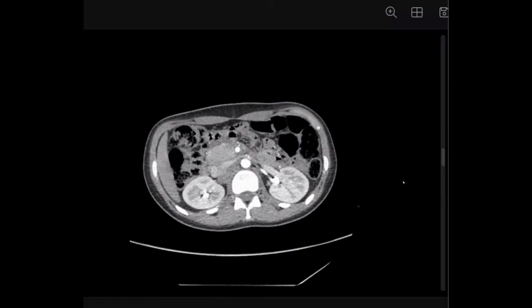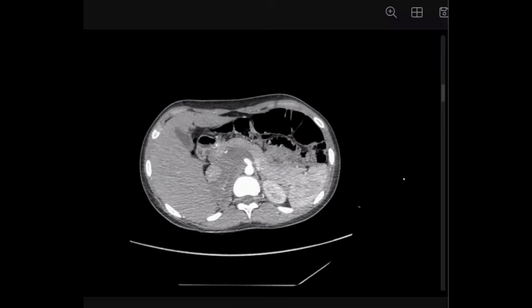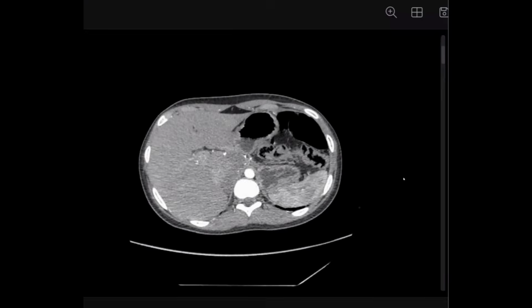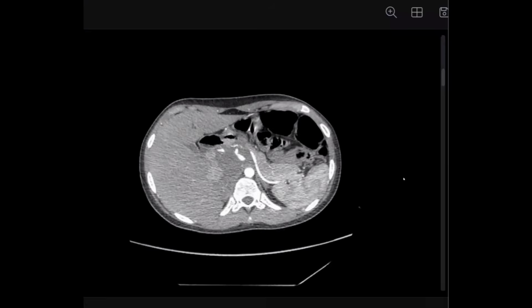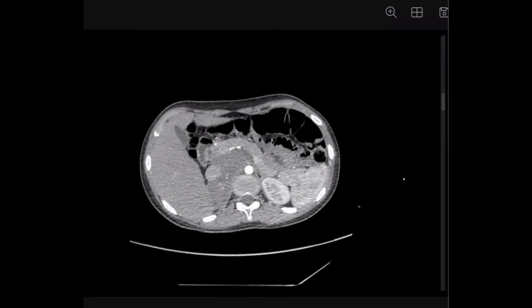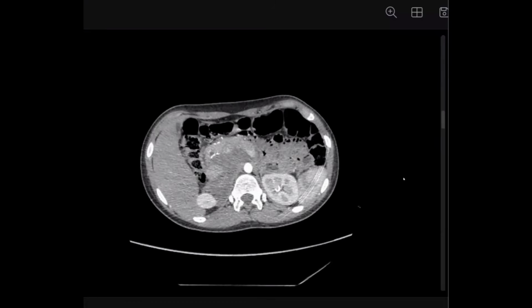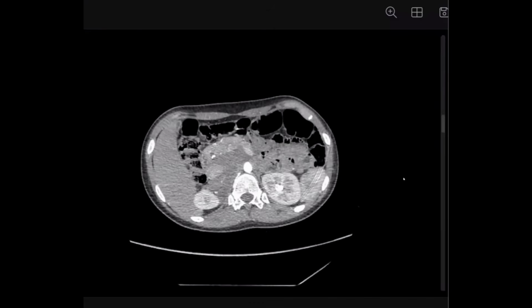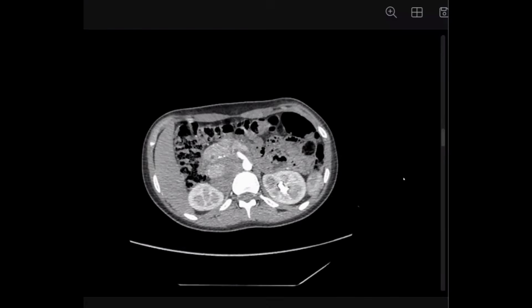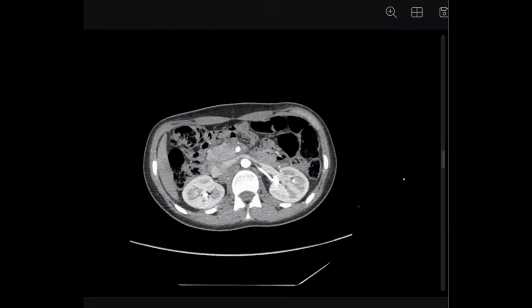I'm provided with contrast enhanced images of CT abdomen, axial slices. I'm scrolling through the whole stack and then I will comment on the findings. I'm going from top to bottom, in which I do not appreciate any significant pathology in the sections through the liver. Gallbladder appears unremarkable. While going downwards, I can appreciate an ill-defined hypodensity in the aortocaval region, which is displacing the IVC towards the right side and displacing the pancreas anteriorly with some blurred fat planes with the pancreas. However, there is no significant invasion or compression of the IVC or aorta.